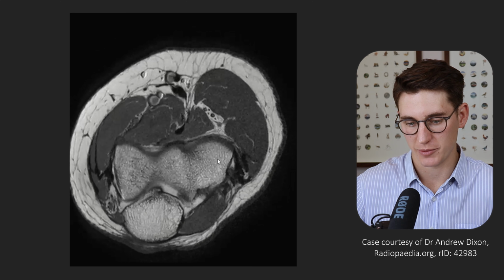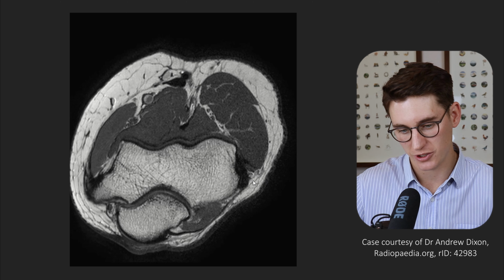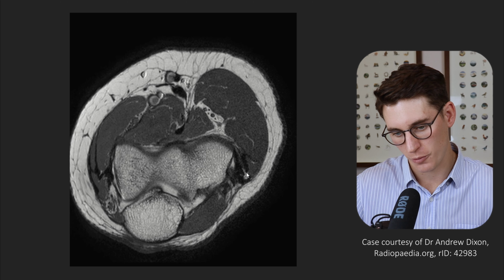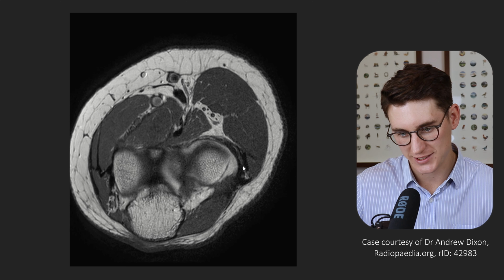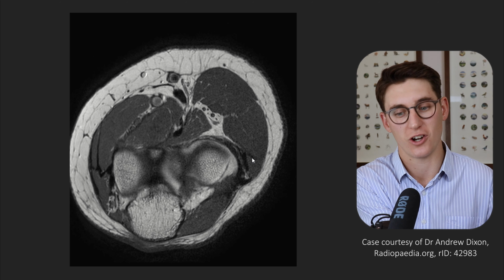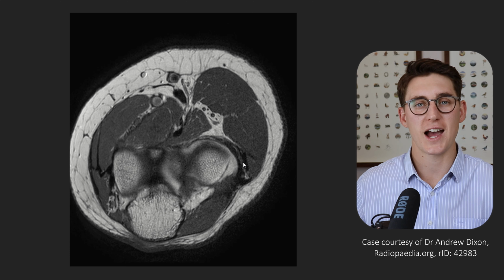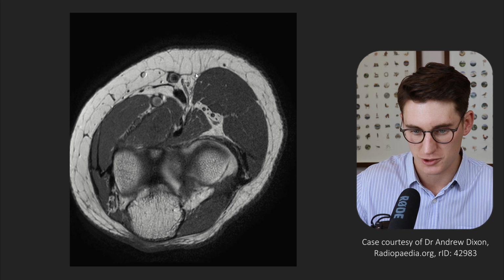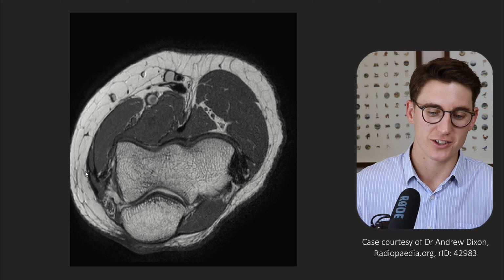Let's have a look at some of the ligaments and tendons on the lateral portions of the image. So we've got our radial side here, so we know that this is our lateral epicondyle. We should, as we scroll down slowly, see a separation of our common extensor tendons here and our radial ligament here. So our common extensor tendons go off into the extensors of the arm, our extensor carpi ulnaris, our extensor digiti minimi, and our extensor digitorum. Further up, we've got our extensor carpi radialis, longus, and brevis, as well as our brachioradialis, which is this large muscle lying anteriorly here.